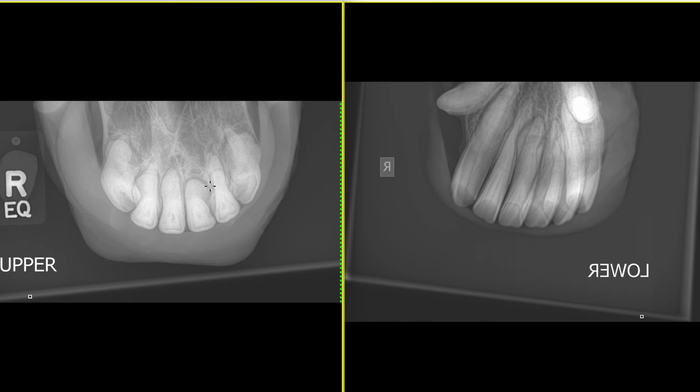You can see this with all of the teeth, and to a greater or lesser extent you can see the more normal part of the root as well. We've got some sclerosis, particularly around the 103, so just around this tooth here we've got a reasonable amount of sclerosis. So that's fairly conclusive for the upper teeth, and it's quite a marked manifestation of this pathology.